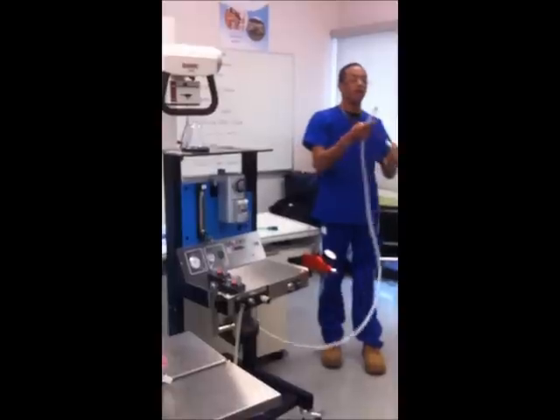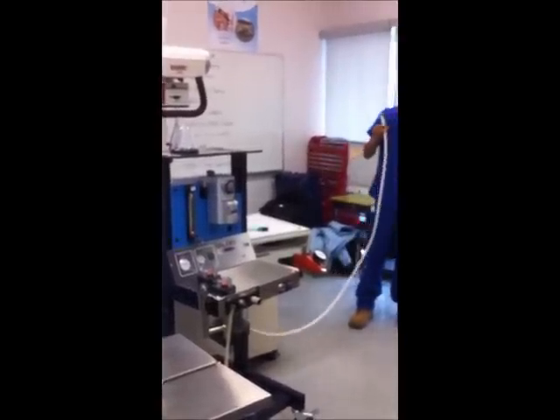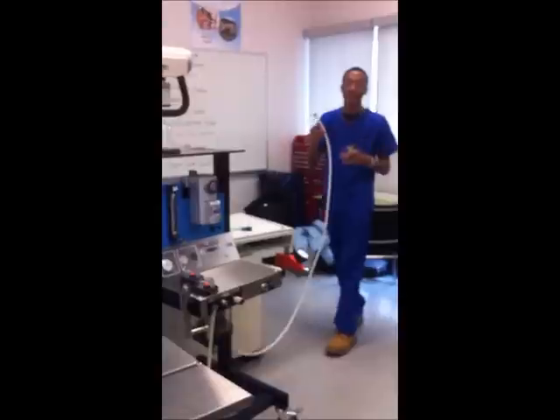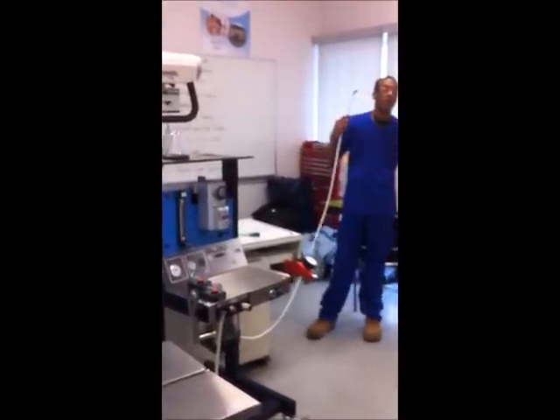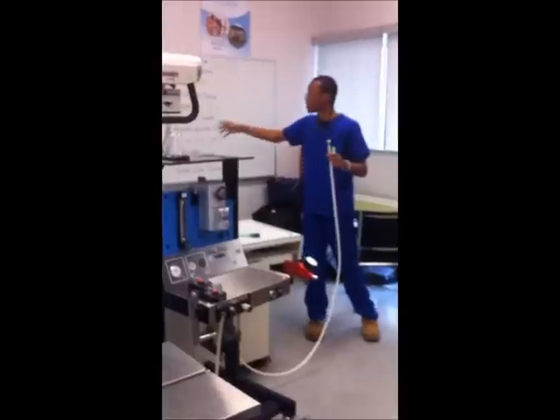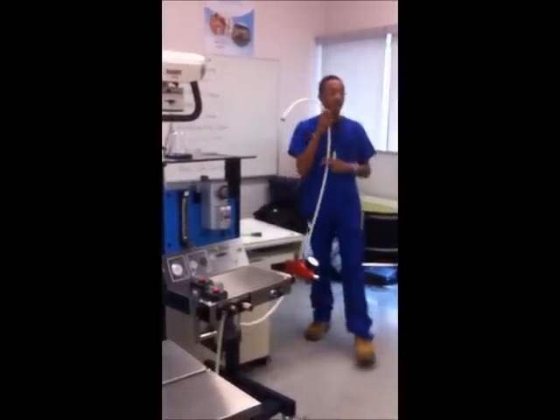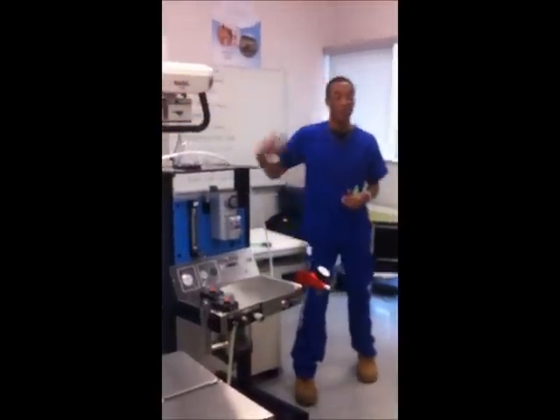Oxygen. Since we do not have an oxygen tank and all that, we won't simulate an oxygen tank or anything like that. So we basically just tell you to point oxygen to this hose. But for knowledge sake, you do know it starts at your oxygen tank, to your oxygen regulator, through this hose, and then the next step, you guys tell me. What's the next step after oxygen goes through the hose?